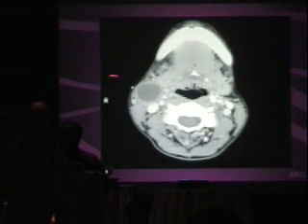Now, what if you have not a simple thin wall, but a nice thick wall like this? It expands the differential a little bit. And let me tell you a little clinical pearl. Even in the brain, if you're trying to distinguish an infected abscess, say, from a brain tumor in the frontal lobe, one of the things you could do is look where the irregular margin is. If the irregularity and nodularity of a thickened margin is pointing in, that's probably an abscess, an infection. And if the nodularity and irregularity is pointing out, it's probably tumor.